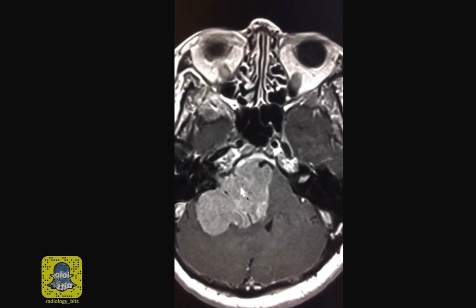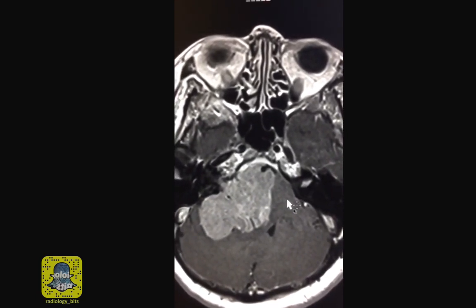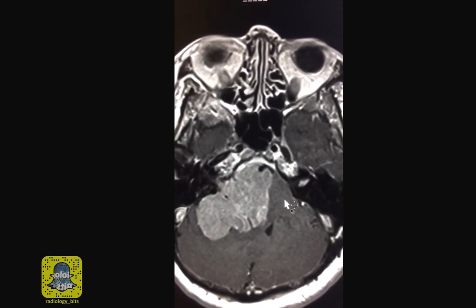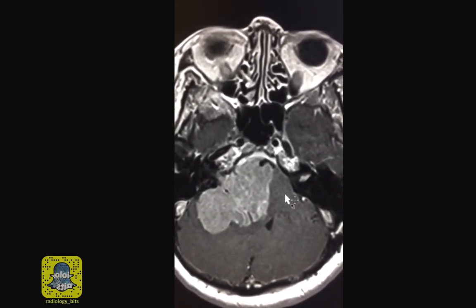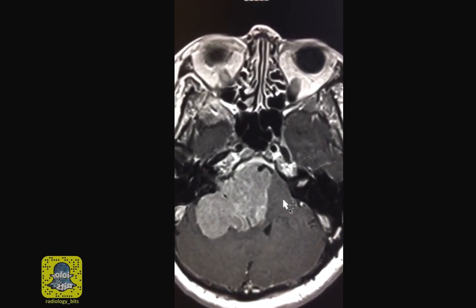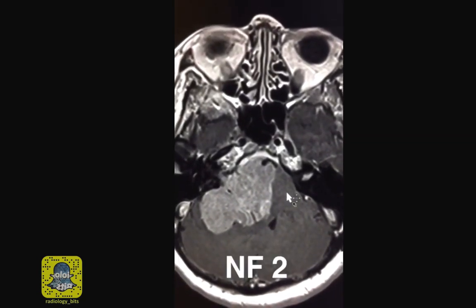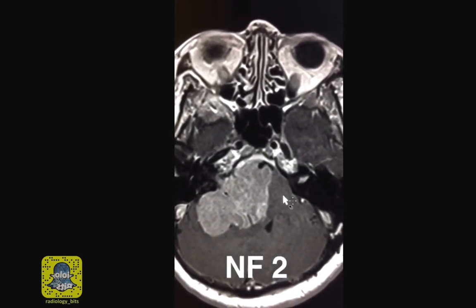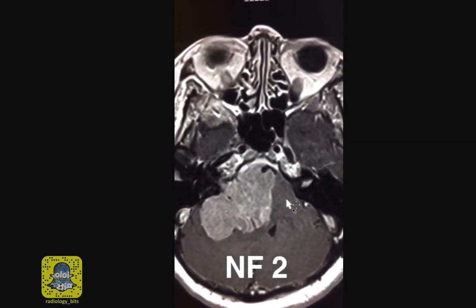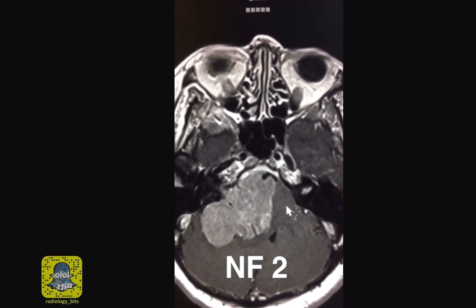Since you have multiple meningiomas and a left vestibular schwannoma, you have to raise the possibility of neurofibromatosis. In particular, neurofibromatosis type 2 is classically associated with meningiomas, schwannomas, and ependymomas. So this was a case of neurofibromatosis type 2. Hopefully in the future we'll talk more about the differences between type 1 and type 2.